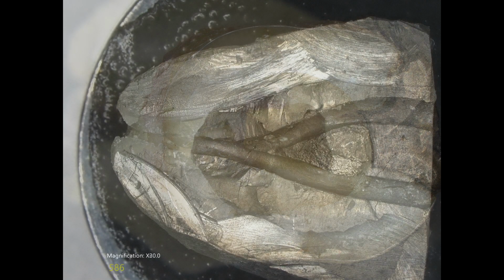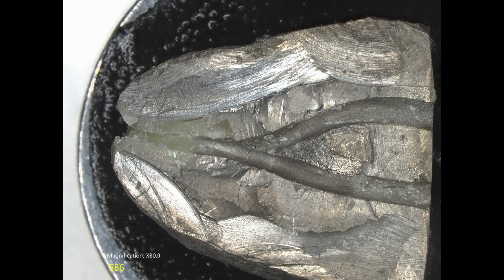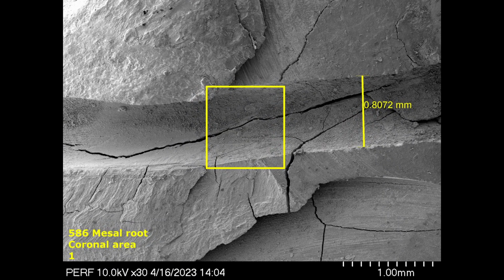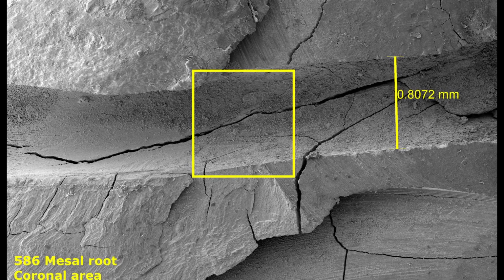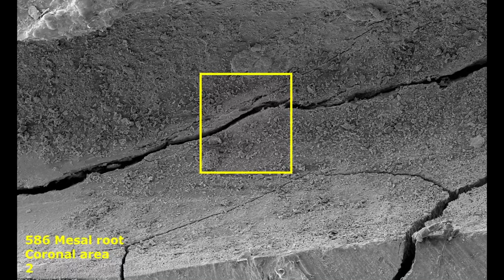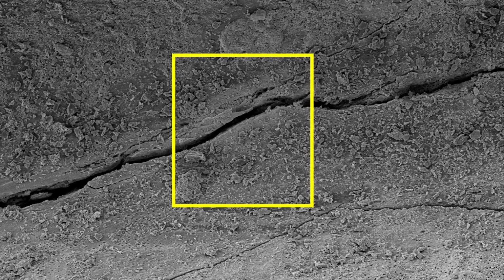We did get a fairly decent mesial root sagittal section, revealing an apparent common terminus for the mesiobuccal and mesiolingual canals. The distal sagittal section reveals a very broad coronal pulpal area, as suggested by the pre-op radiograph, and a single terminus. Going to the coronal area of the mesial root, you see a relatively clean canal with minimal instrumentation debris.